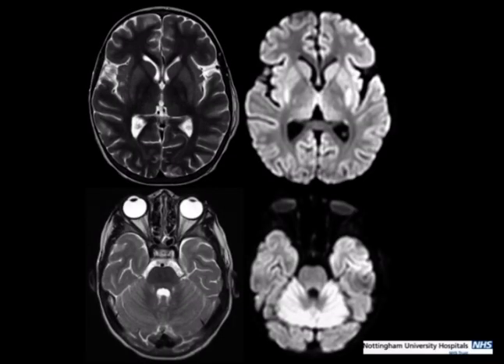This is a fairly common pattern, probably doesn't project fantastically. The T2 is very difficult to pick up anything abnormal on. But if you look at the posterior putamina bilaterally, you can see there's diffusion restriction there. And the other thing that isn't very widely reported is just how much the cerebellum can be involved in hypoxic ischemic injury. So you want to be comparing the normal signal of the temporal lobe cortex to the diffusion signal change in the cerebellar cortex to see that it is really quite dramatically different. Very easy to miss on the T2 weighted imaging, I think.